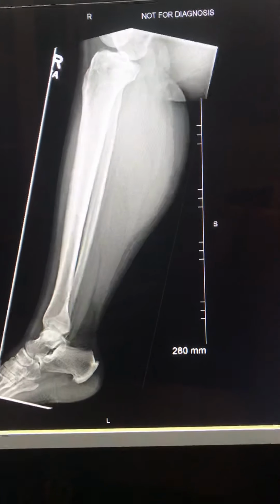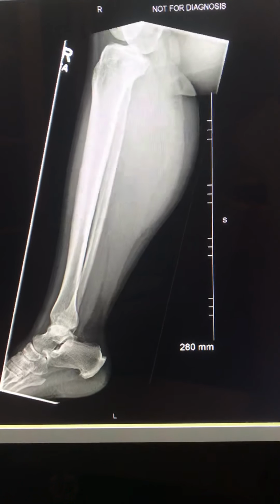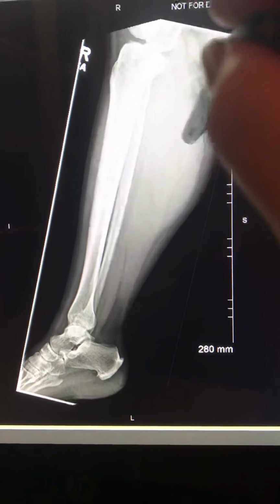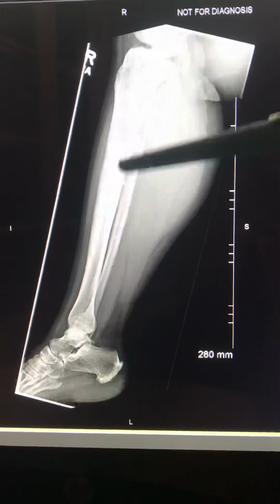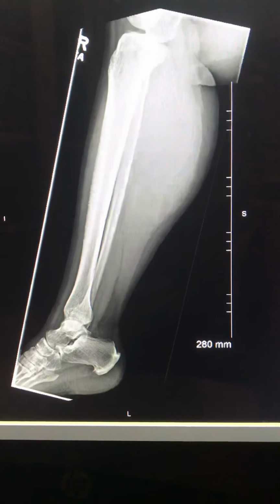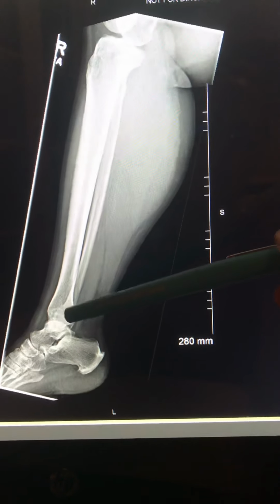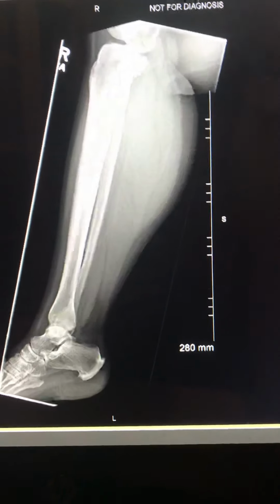far enough lateral. I believe that an angle of the X-ray tube coming in, instead of perpendicular, just a little angle like that, a small angle could have opened this space between here and then brought out the fibular head, and then superimposed the distal fibular head.